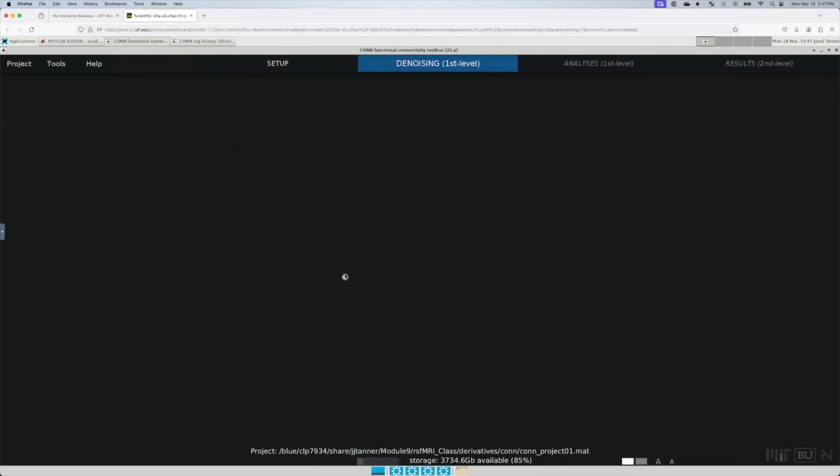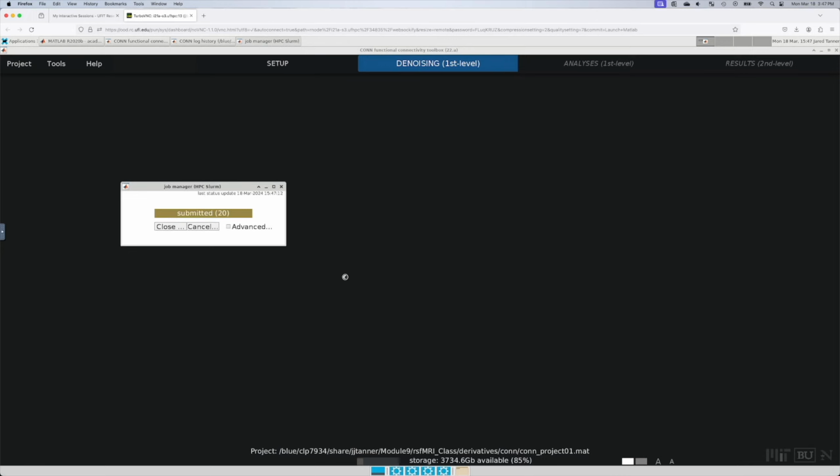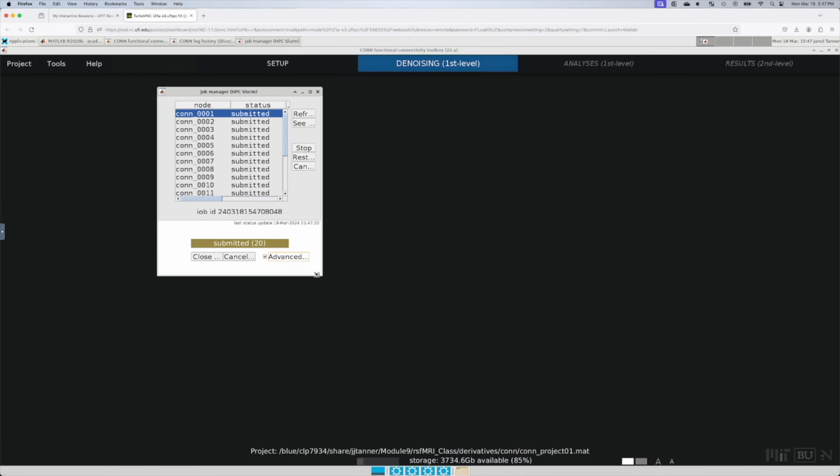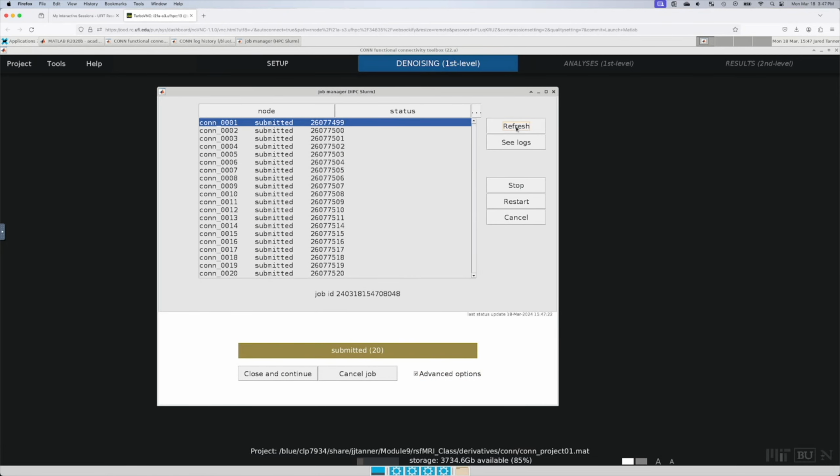This will actually be really fast. And I might pause the video, because it could take a little bit of time for this to actually start. But this is a fast step, fast processing. And so we'll let this go, and I'll come back in just a minute or so. But again, you can always click on advanced. I like to make this a little bit bigger, and you can refresh occasionally just to see if it has started yet, but we'll be back in just a little bit.